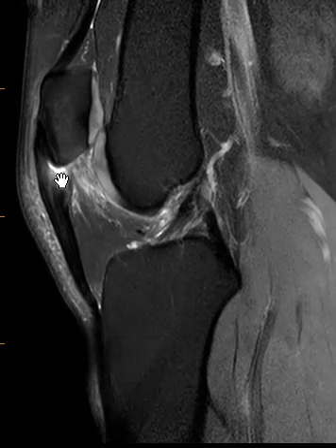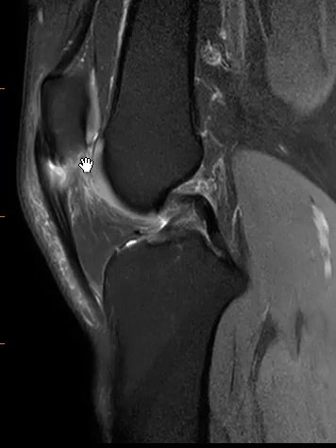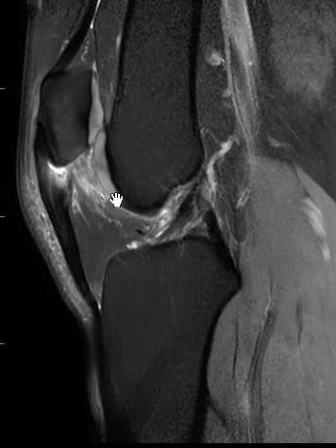And when we see this thickening and edema and sometimes peeling off here, we call this jumper's knee. They can also get the edema in the Hoffa's fat pad like this patient. And these are often people who play sports like basketball where they jump and they have abnormal mechanics of stress at that patellar tendon attachment.